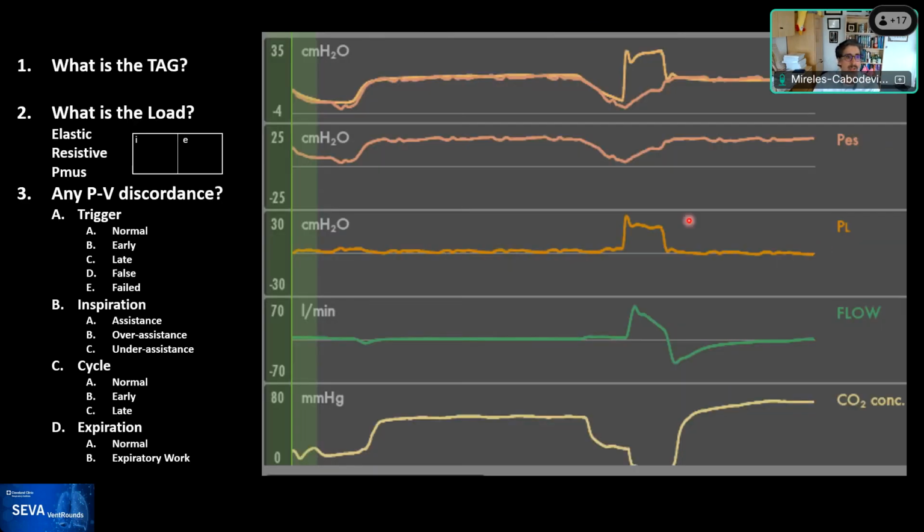And so for that, I give you with love this graph. I'll just orient you towards what you're seeing. You have the airway pressure in an orange or yellowish hue. In pinkish, you have the esophageal pressure. Down here, they're overlaid, and over here, it's isolated.